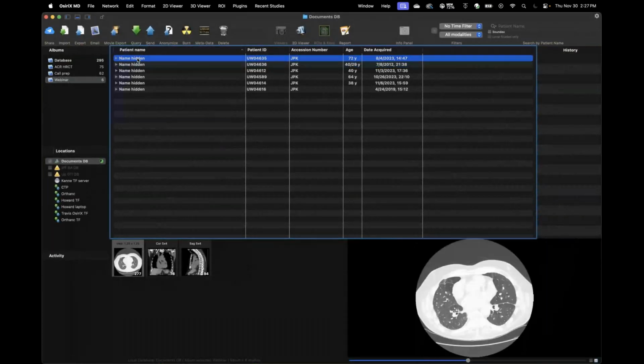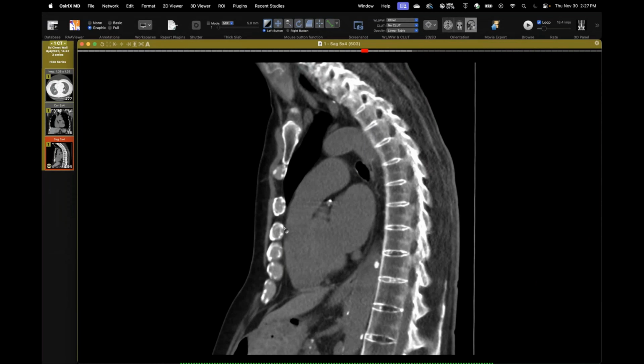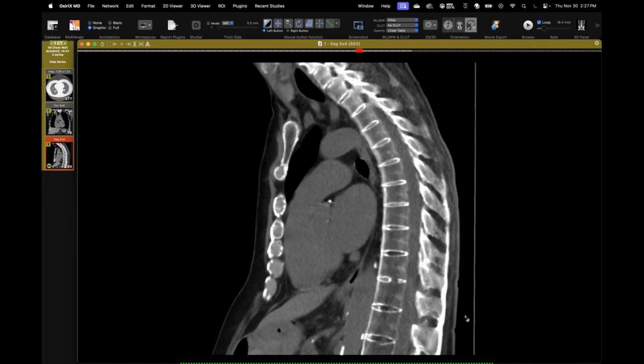And then this is a case of something I have been waiting to see, and it may or may not be related. So you can see on the sagittal here, there's no question what the diagnosis is, but there's beautiful ankylosis of the thoracic spine. You can see the fusion here posteriorly. And I didn't show, but this patient's sacroiliac joints are fused solid.